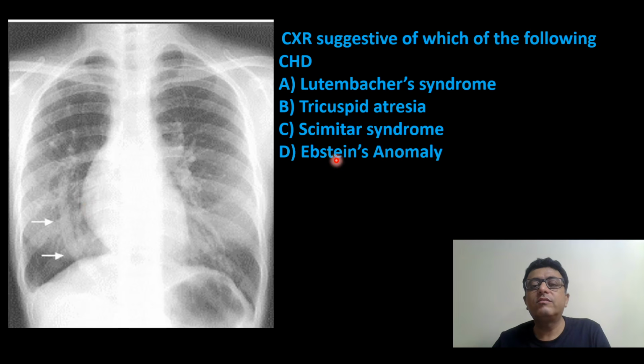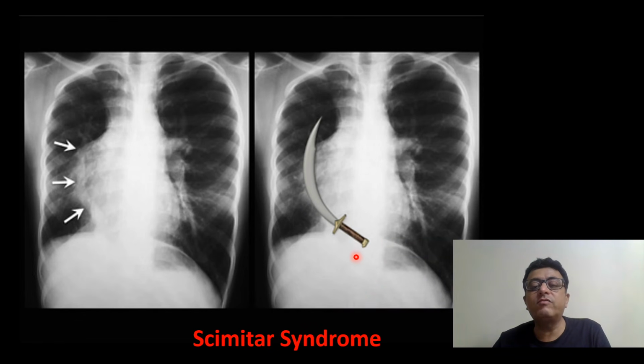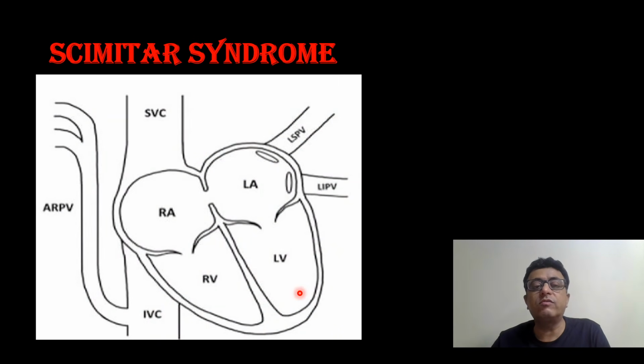It is Scimitar syndrome. See why we call it scimitar. This channel is in the shape of a scimitar, a Turkish sword. If you find such a channel, what is scimitar syndrome? Now see here, concentrate on this.